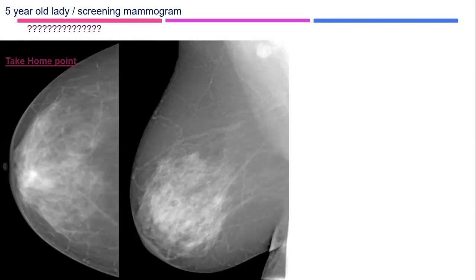The left breast demonstrates the same skin thickness. Okay. I see in the CC view there is a denser area in the retroareolar region. How do you label this area? I think it is a focal asymmetry because in the MLO it is not seen. So if it is not seen, will it be focal?